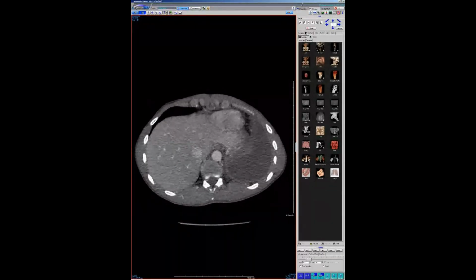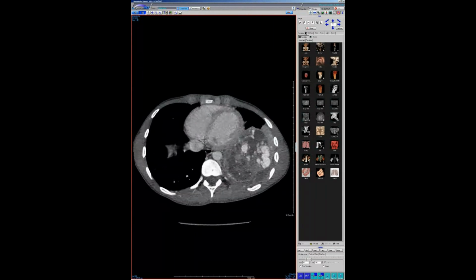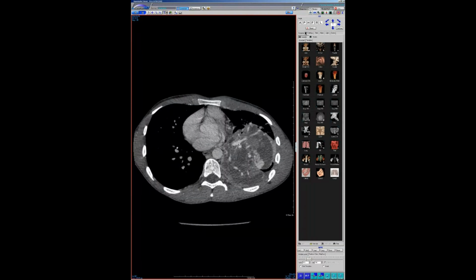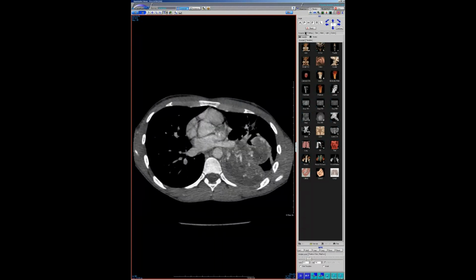So a year before? What is that large vessel going through it? No, it's a vein. So it's a vein that made there a year ago. It wasn't there a year before. Wow. So it's this vein that does this loop-de-loop, and it literally just makes a loop-de-loop, connects up, goes out here, and it's just this.